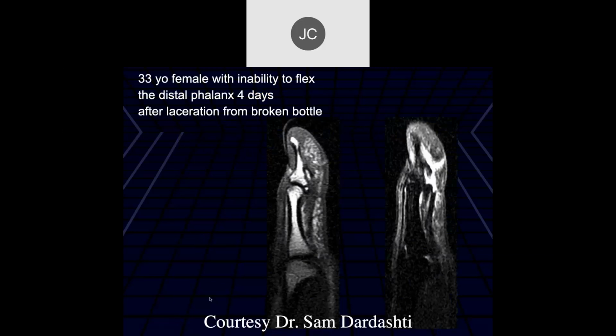All right, it looks like the flexor tendon is torn at the level of the IP joint of the thumb, right? So how do you think this happened? Yeah, laceration. You see the soft tissue laceration there as well. There it is. So there's a laceration.